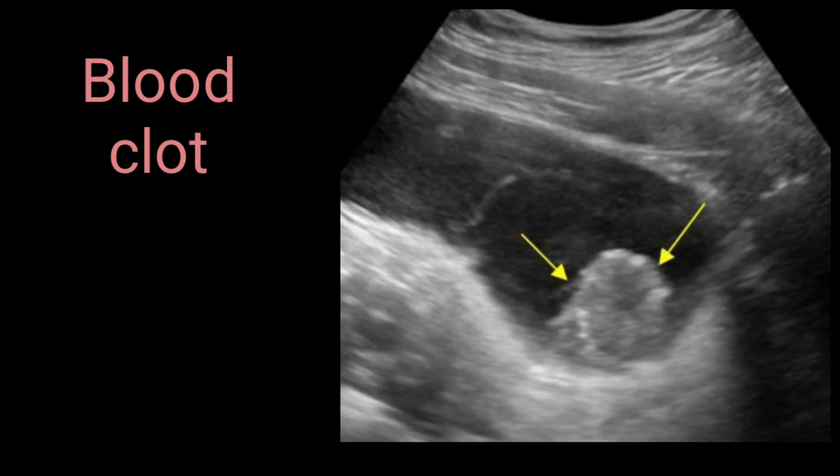Then you will be able to see the movement of the clot. If it slips to the right and left side respectively with the movement, then it's definitely a clot, and if not, then a mass can be considered. So always be careful distinguishing between blood and intraluminal mass. This slide was a blood clot and the patient had a history of hematuria, and it is obvious here that this is a blood clot due to collection of blood within the urinary bladder.